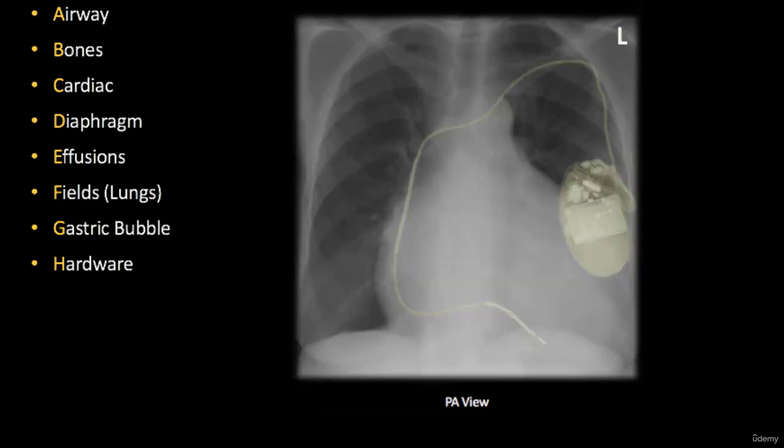If patients have any devices in their bodies, such as nasogastric tubes or electrostimulators or EKG electrodes attached to the skin, of course all these devices will appear on the X-ray too, and it will allow us to check whether they are installed correctly, whether they are in the right place or not. So this is one more point to focus our attention on.